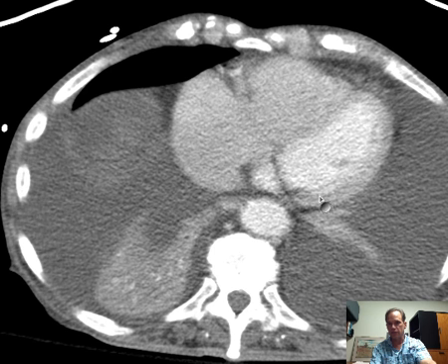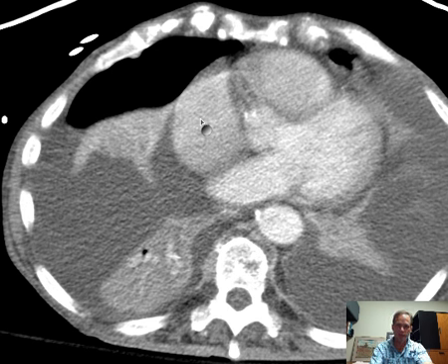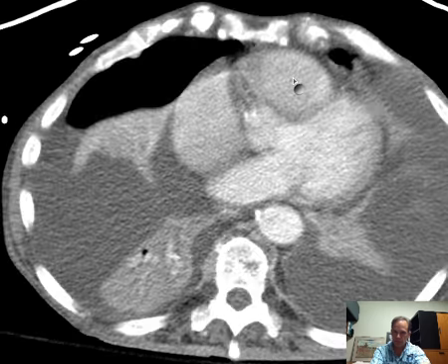Left ventricle has thick muscle, right ventricle does not, and it is more rightward and more anterior. Then you know that these two chambers here correspond to atria. The left atrium goes to the left ventricle, the right atrium goes to the right ventricle.